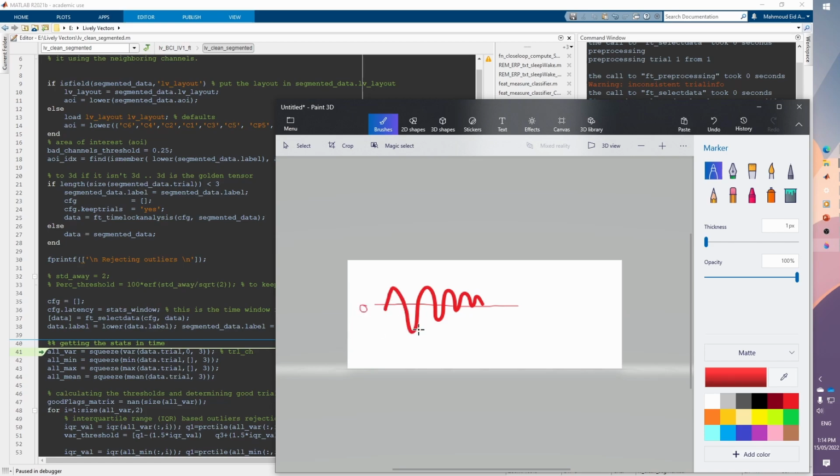So we are basically subtracting the mean from all samples, and if we are going to calculate the variance, it can be described as how far away the data points are from the mean. So basically, if we have data like this, and if we said that this is an average variance, this is not a huge variance.